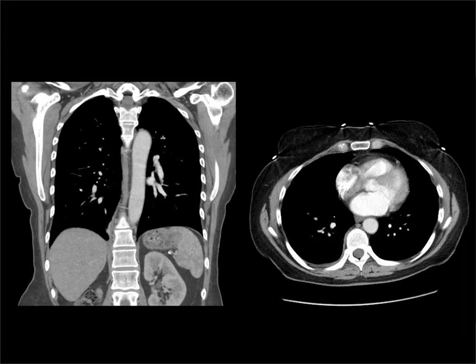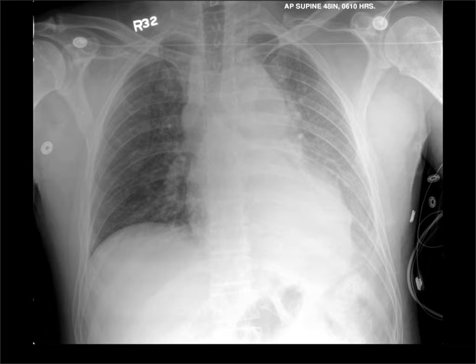So if you have a left lower lobe pneumonia, or a left-sided pleural effusion, or left lower lobe atelectasis, you're going to have soft tissue against soft tissue. You will not have that air soft tissue silhouette, and you will lose that para-aortic line that you should be able to see. So here's a patient who has a traumatic aortic injury.